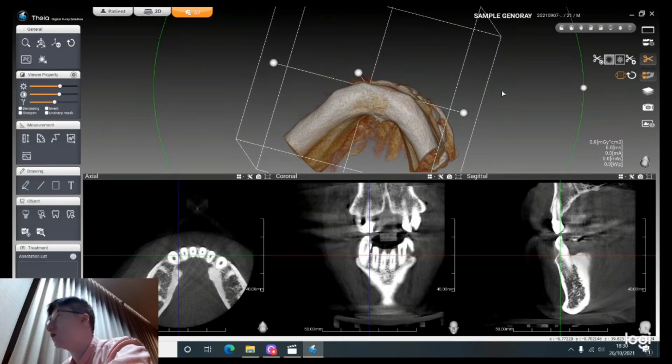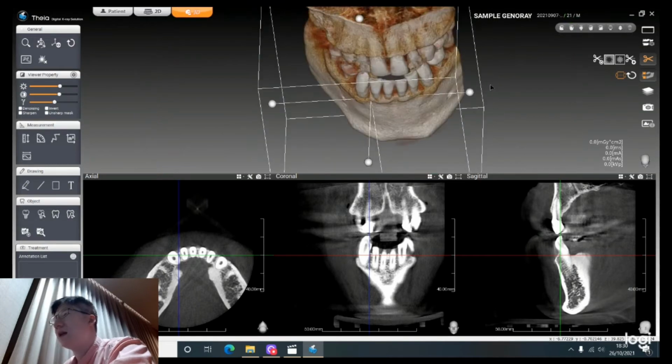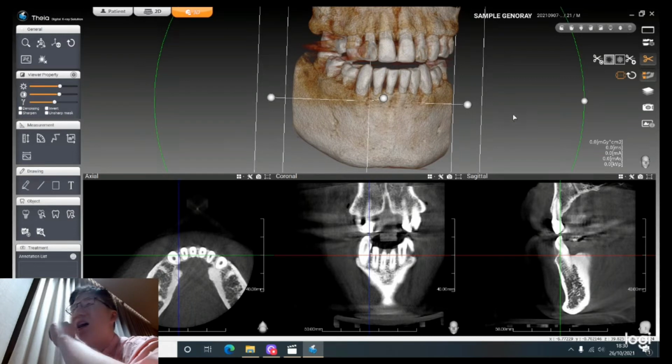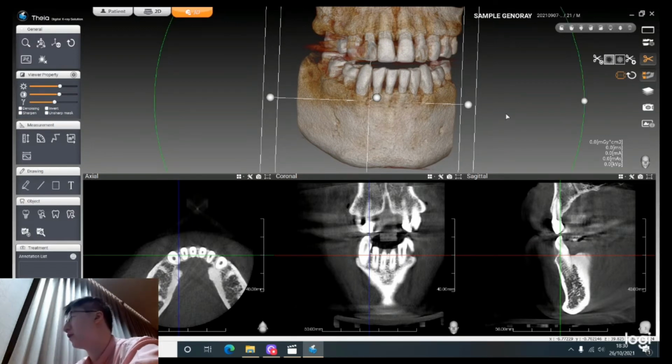Okay, so that would be useful in that case if you wanted to clip the pictures. And let me just say, this is 3D rendering, right? So you see my graphics card sort of struggling here. You will be provided with, I believe, an RTX 2060 in the PC of Genoray. So that's quite a high spec graphics card. I'm sure it's more than 4 gigs of VRAM. That would help in rendering these kind of pictures.